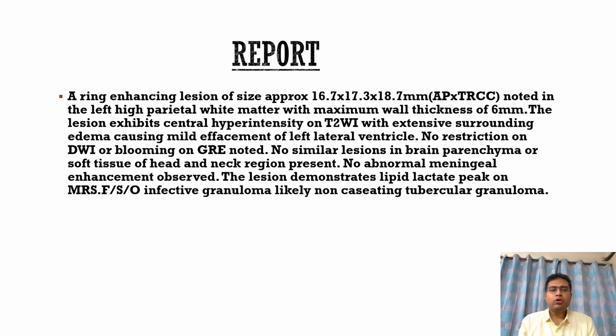So this is the report that I had given: a ring enhancing lesion was seen in the left high parietal white matter with maximum wall thickness of 6 mm, and the lesion exhibited central hyperintensity on T2 with extensive surrounding edema, causing effacement of the left lateral ventricle. There was no restriction on DWI or blooming on GRE, and no similar lesions in the brain parenchyma or soft tissue of head and neck were present. And there was no abnormal meningeal enhancement observed.